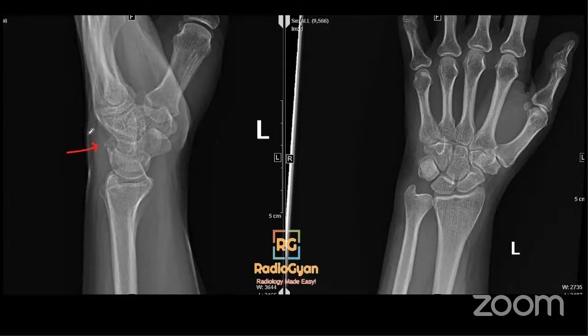Perfect. So this is a dorsal avulsion fracture of the triquetrum, which is also known as a pooping duck sign. This is commonly seen in patients with a fall on an outstretched hand. If there are no other associated fractures, these usually heal. They don't require aggressive management. Another differential would be an os triquetrum, but that's not that common, and you won't have that typical history in those patients.